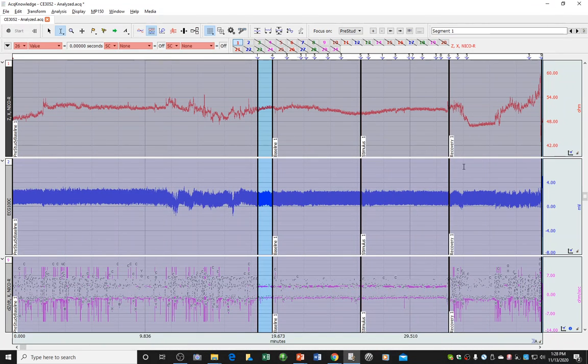So once we have a little bit of a theoretical idea in our mind as to what pre-ejection period is and why we're measuring it, I'm going to go back to the raw data that you may have gathered if you're trying to use PEP in your research. There are three aspects that will be used.